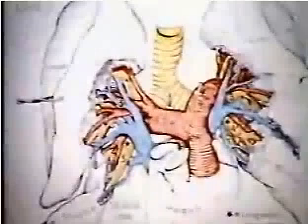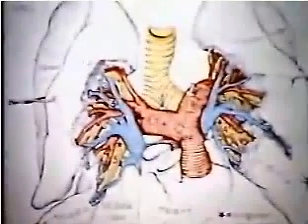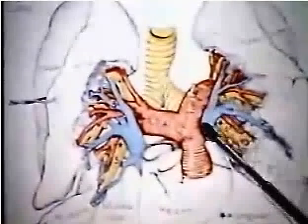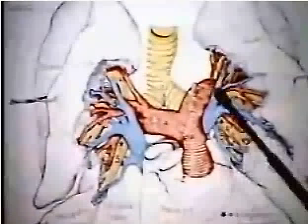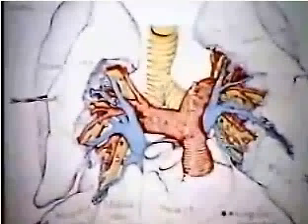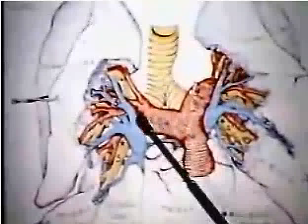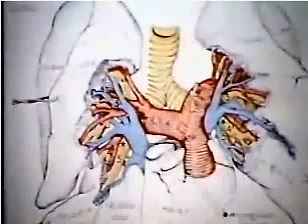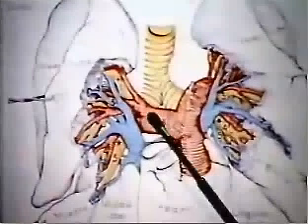Let's look at an anatomy diagram of this region. The structure that runs in front of the left bronchus, as you can see, is the left upper pulmonary vein. It curves around at a fairly steep angle behind and underneath the left pulmonary artery, which curves over the bronchus. Notice the orthogonal relationship of the right pulmonary artery, and notice that on the right side, the vein is in a different relationship. It's not in front of the bronchus, it's in front of the right pulmonary artery.